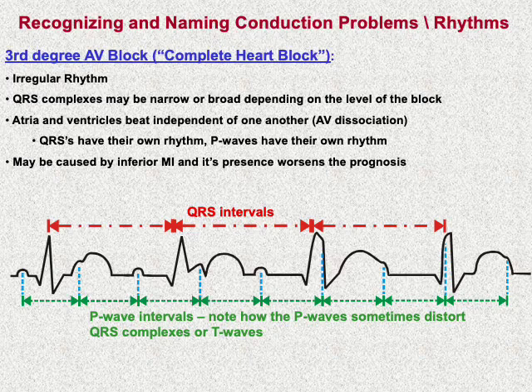And then the ventricle escapes, usually in the His-Purkinje escape. So we have QRS intervals that are also constant. This way we will have a ventricular rate of 30, for example, or 35, and then the PP or atrial rate of 100. So complete dissociation. To differentiate it from second degree, we see here the PR interval is very variable.